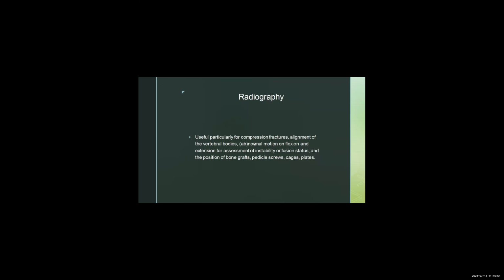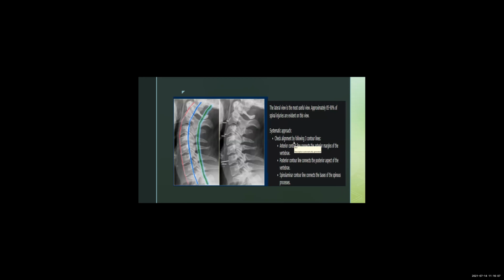And sometimes when they have surgery of the spine, they put in some metal hardware, and X-rays can be good for looking for any abnormalities with the hardware, so looking in the post-surgical setting. So here's an example of an X-ray of the spine. This is the cervical spine.